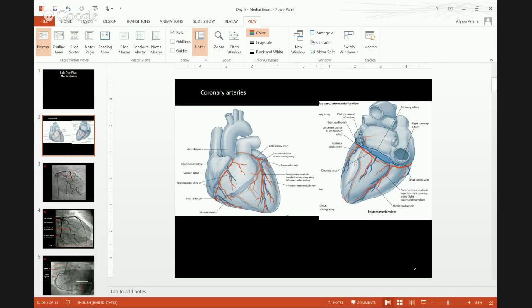Okay, and this next slide, again, this is kind of small. You want to be able to label all the things, I'd say the easy things to label. And here it conveniently tells us we're at T2. We can also see the big manubrium here, so we know we're pretty high.